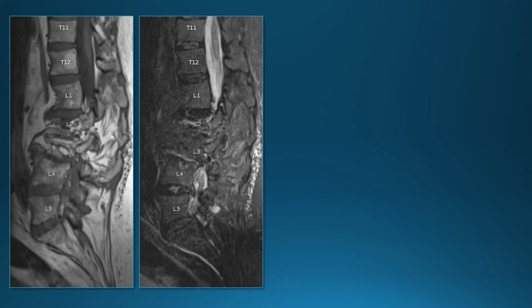We looked at the L3-4 disc. It is a little bit bright over here, but the prevertebral soft tissues looked okay. L4-5 disc, there is a little bright signal on a disc again here. We don't see anything in the prevertebral soft tissues. The bone marrow, nothing obvious. The end plates looked okay, so not clear cut.